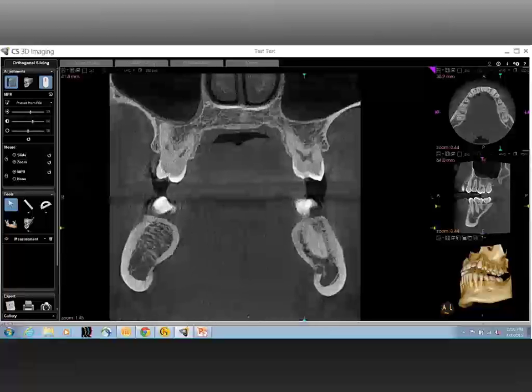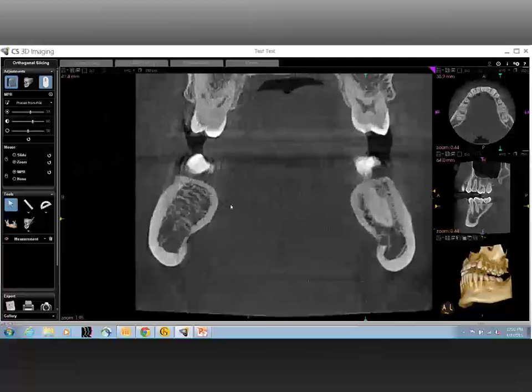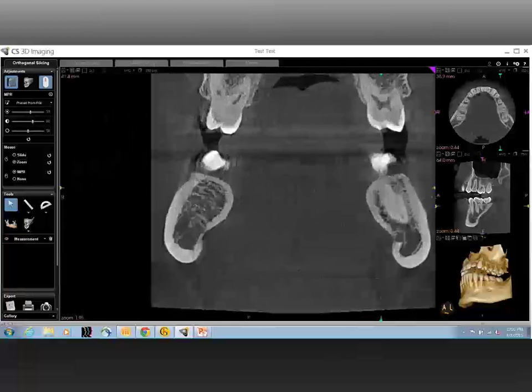Since the traditional way of examining bone density cannot be applied to CBCT, it is imperative to go through all these three different types of bone, or for lack of better words, different parts of bone, to understand a certain pattern in which the bone could look different from one side to another or between two different individuals.